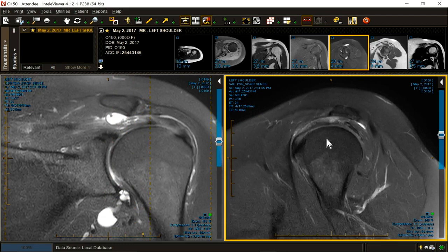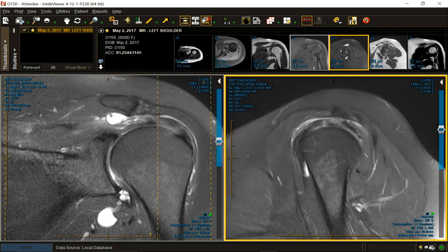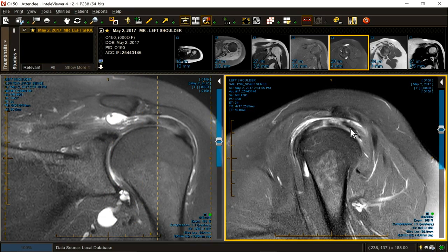Let's go out to the side. And I'm going to window and level it because I want a little crispier contrast because they didn't give it to me. I'm giving it to myself. There she blows right there. That's not all. This is the supraspinatus. We're in the sagittal projection. Supraspinatus, infraspinatus, what's in between? The fibroelastic membranous connection between the two, known as the posterior rotator interval.